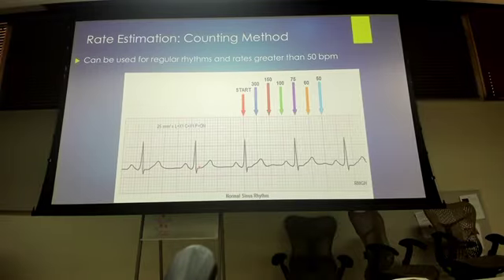So those things can increase and decrease our heart rate, along with medication. So how do we determine, when we look at this EKG, when we look at this grid paper, what the heart rate is? And also, why is that the first thing we look at? We talked about myocardial infarctions, that's a heart attack, right? Why don't we look for a heart attack first?